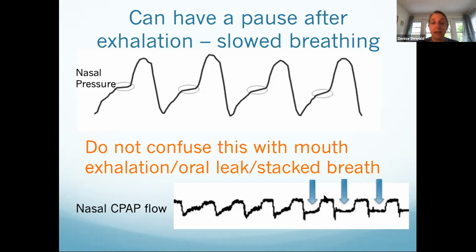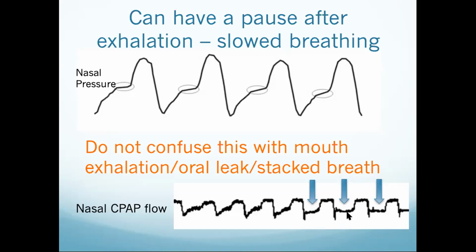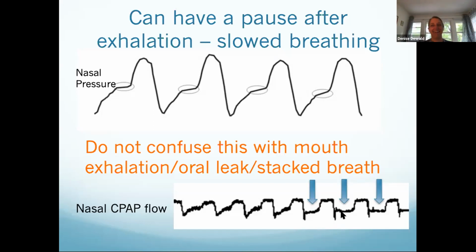So have you all seen this? Have you noticed this when you've looked at studies? I have not seen that, but maybe I just didn't notice it. You didn't see it. It's there all the time. So you could keep an eye out for that.